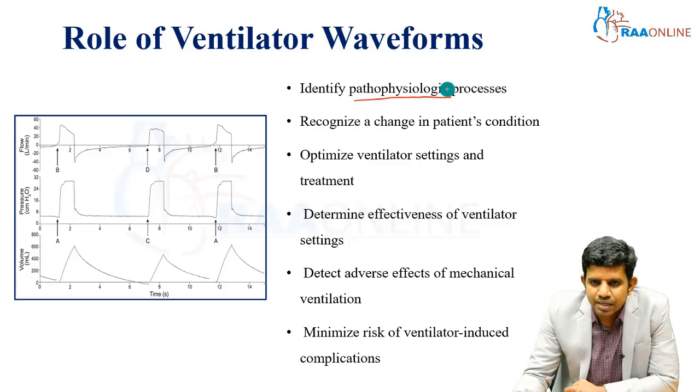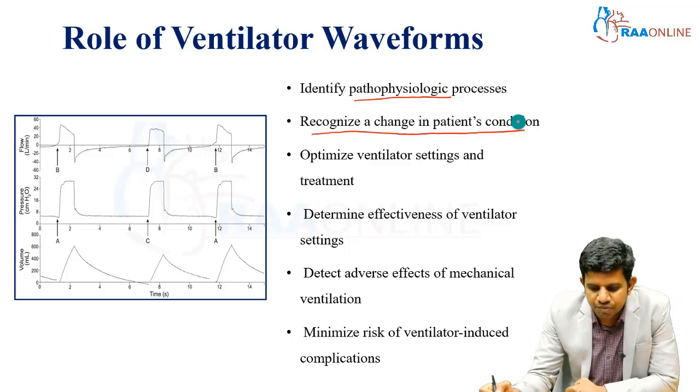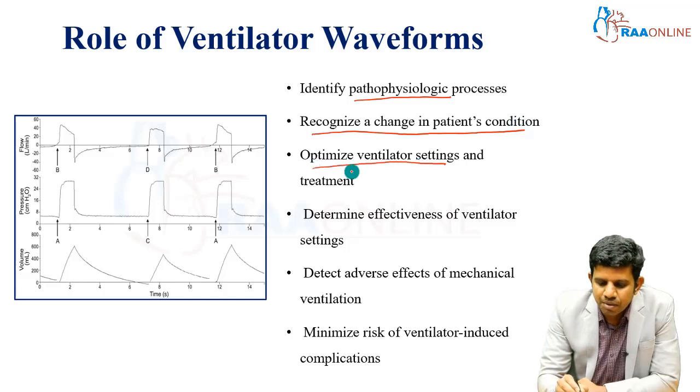Second thing, recognize the change in the patient's condition. Patients in ICUs are very dynamic in nature. For example, compliance may be normal in the morning and may worsen during the ICU stay in the afternoon, from pulmonary edema or simple aspiration. We can recognize the change in the patient's condition from these ventilatory waveforms. From the change in condition or pathophysiological process, we can optimize our ventilatory settings, and maybe modify treatment also.